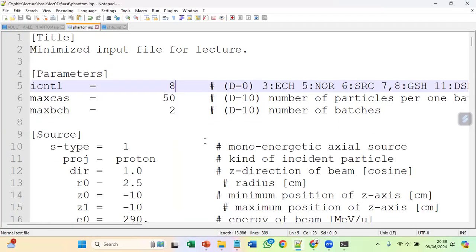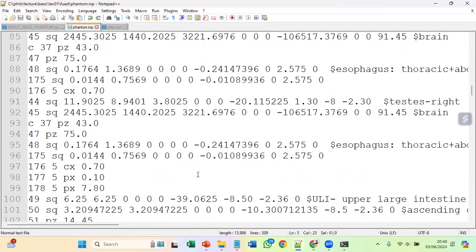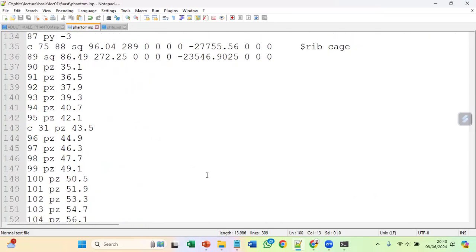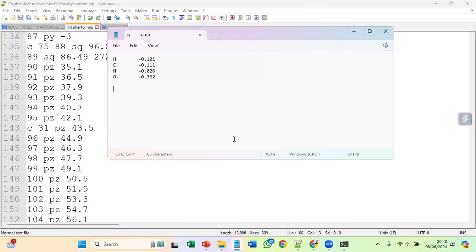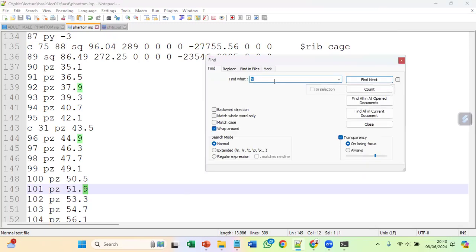So we can manually delete that, one by one, but for me, I use tools like Ctrl+F, Ctrl+F. So wait, Ctrl+F. I press this button, so this window will pop out. It's like in Microsoft Word.